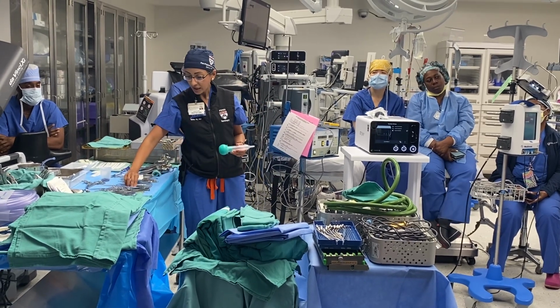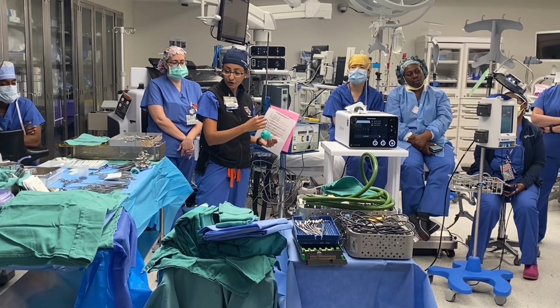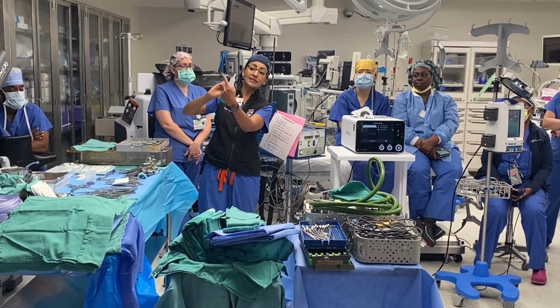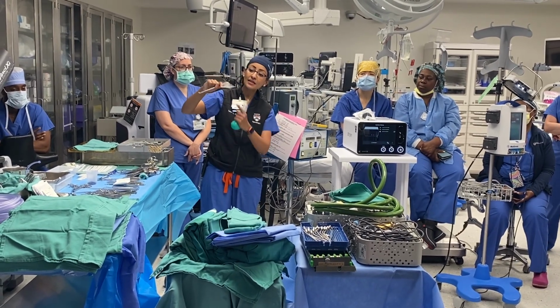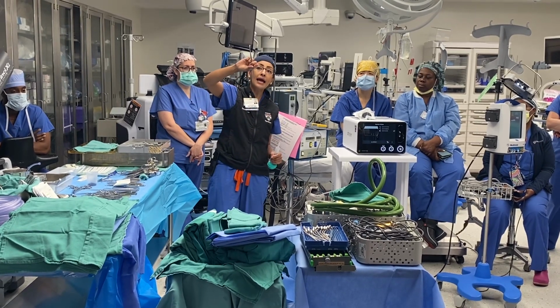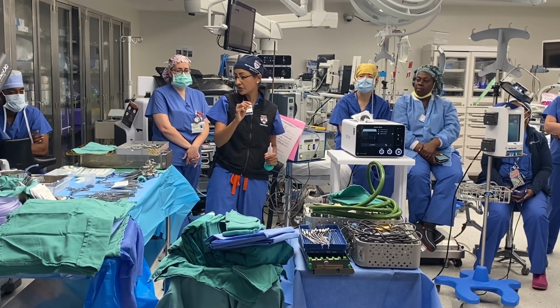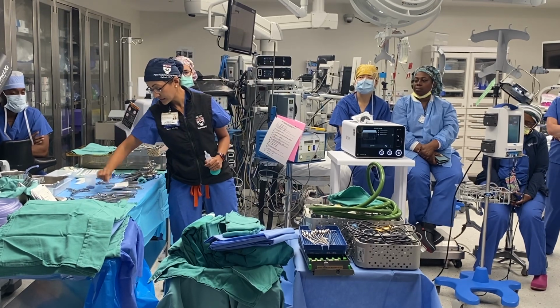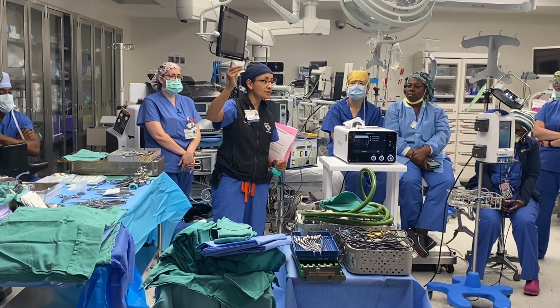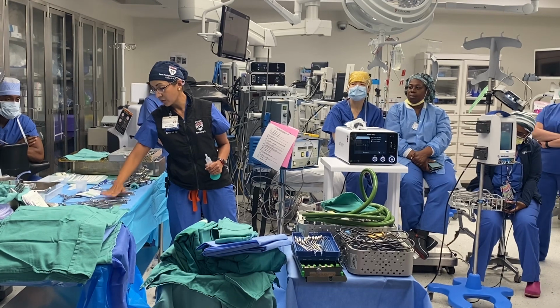Sometimes at this point, if we need to take tumor or blood or whatever off of critical structures, we're going to use things like the Penfield 1. Penfield 1 has a nice little cup at the tip on one side, and the other side actually looks like a Penfield 3 but doesn't have as much of an angle there. And this helps us dissect off the brain, etc. So this instrument's a workhorse inside the dura. Another instrument that we'll use is a Pen 4 sometimes to similarly do that dissection. Those are the big ones for big stuff.